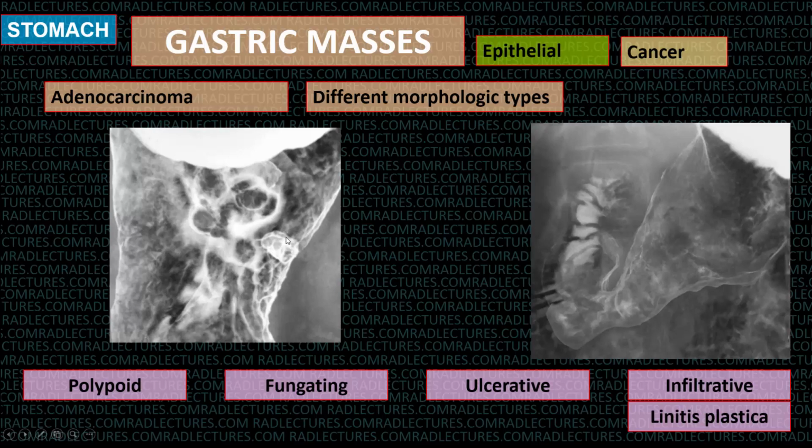It is not like a regular polyp that we saw on the previous slide. And this part of the cancer, this is a different tumor. It's all irregular, and it has a fungating appearance. It is kind of breaking down on top. And so this is one type.